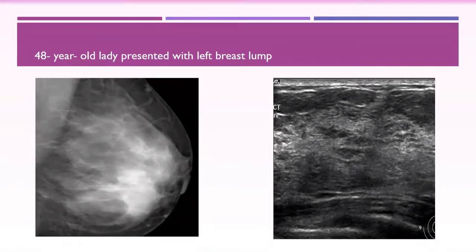The parenchyma is tenting up and pulling the superficial layer of the superficial fascia. So, tethering. Yes, causing tethering. We call this an element of fibrotic changes, but not like the extensive stromal fibrosis. Still, it is an element of fibrotic changes.